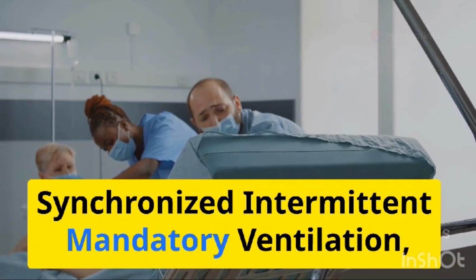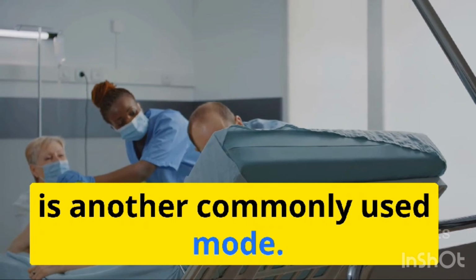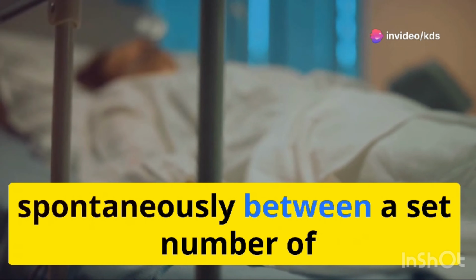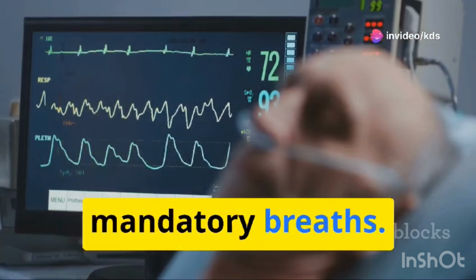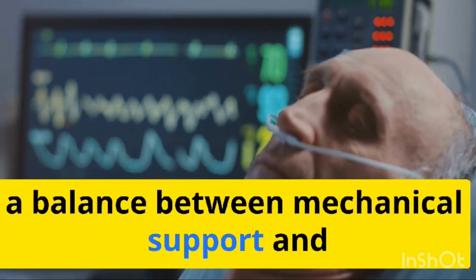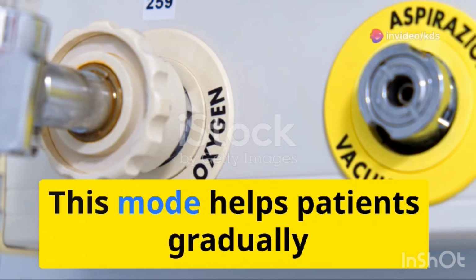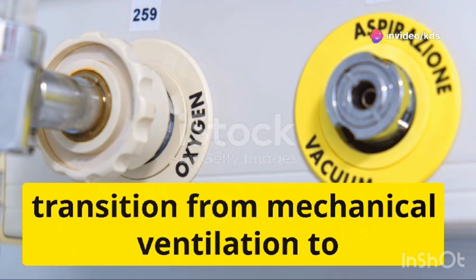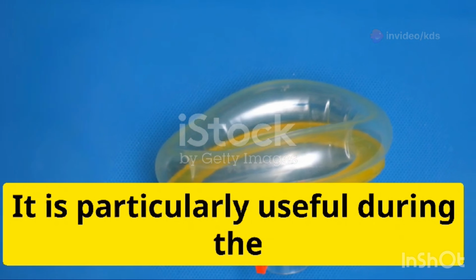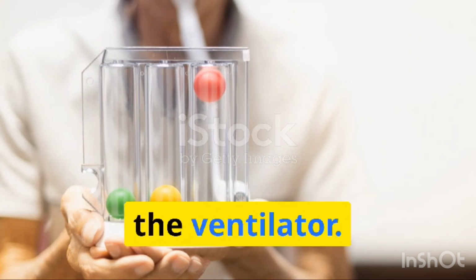Synchronized intermittent mandatory ventilation, or SIMV, is another commonly used mode. SIMV allows the patient to breathe spontaneously between a set number of mandatory breaths. This synchronization helps in maintaining a balance between mechanical support and the patient's own respiratory efforts. This mode helps patients gradually transition from mechanical ventilation to breathing on their own. It is particularly useful during the weaning process, where the goal is to reduce dependence on the ventilator.